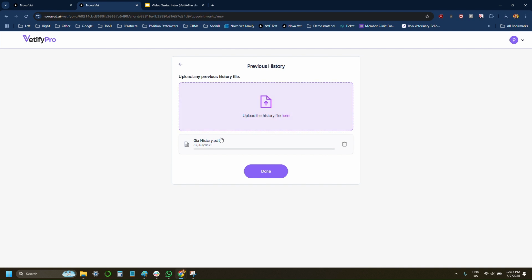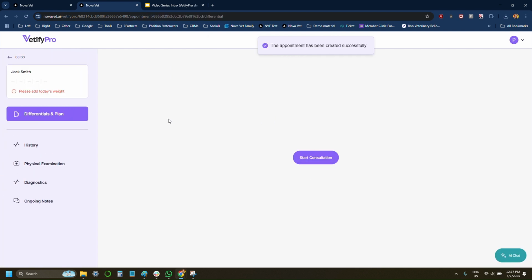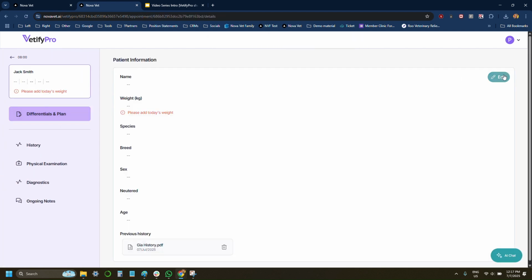And this is very important. This history is either downloaded from your practice management system or it comes with the client if they're coming from another clinic. Very importantly, most vets don't have time to read this whole history. So here you can just upload it and the algorithm takes it into account for its recommendations. Okay, so we finish here, we go into our consult, and let's add Gia's information.